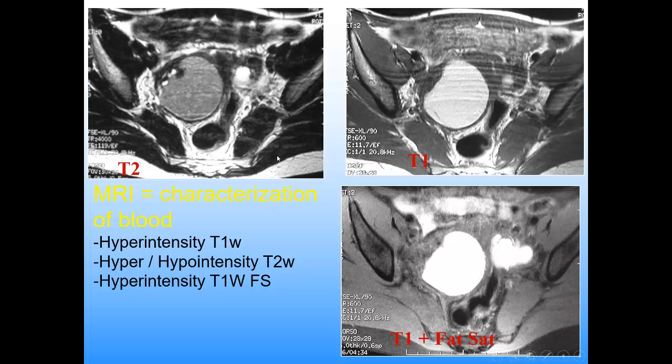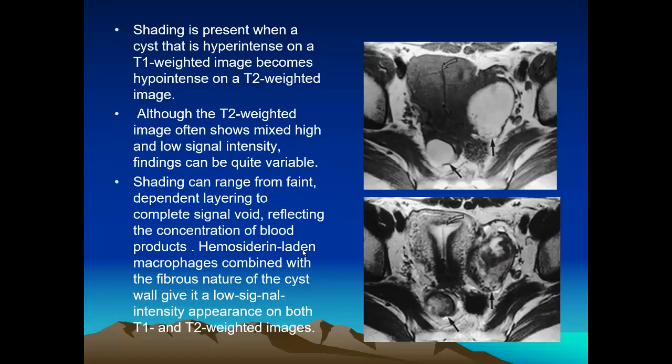And we have here other diagnostic criteria for endometriosis on MRI. We find T2 dark spots, one of the characteristic signs for chronic blood. So this is an endometrioma in the ovary. But not all cases of endometriosis are like this. Here is another case, it is bright signal on T1, but it is heterogeneously bright and low signal on T2, not the typical shading effect we see on T2.